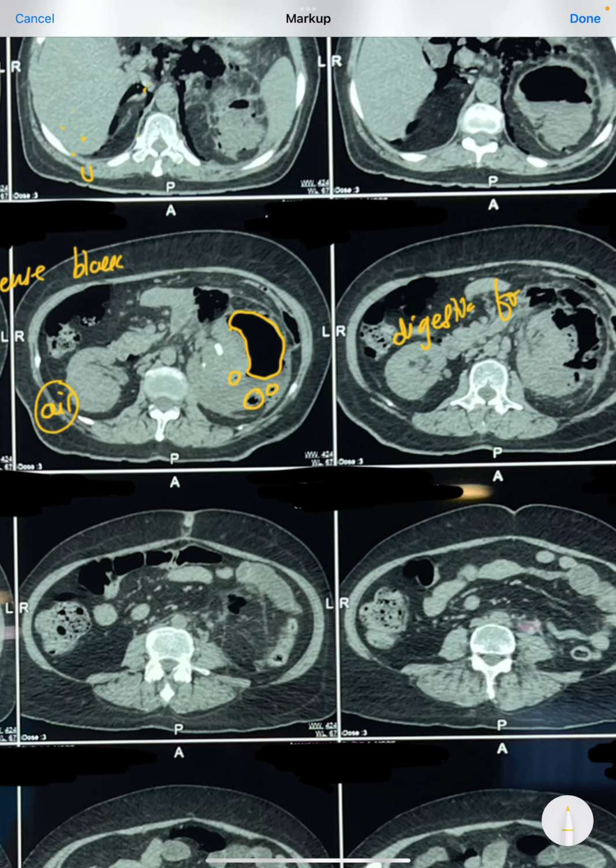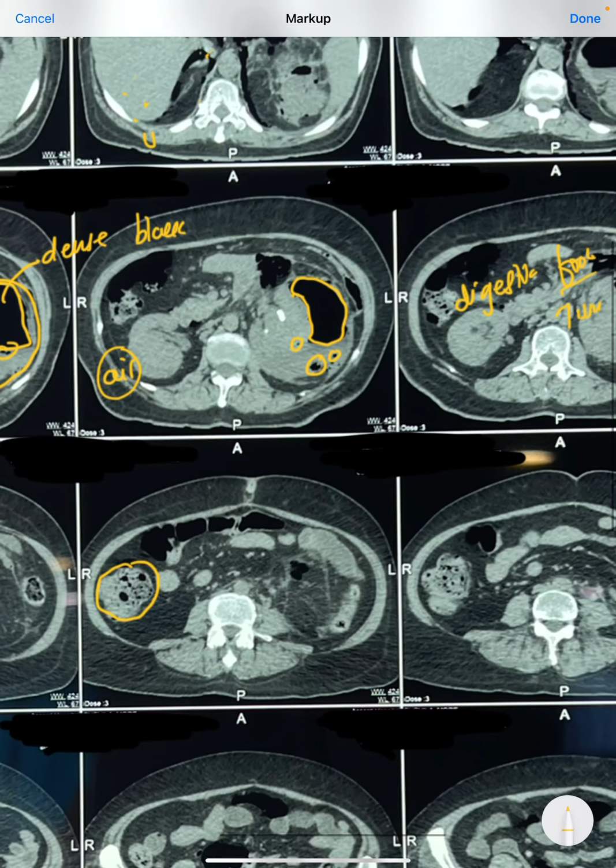Either it is food or a tissue which gets damaged, which gets necrosed, which actually creates or liberates air. So whenever there is air, either it has to be in the gut system like the small intestine or large intestine or stomach, which is very common like this. Now as this is the right side, we know that on the right side we have the ascending colon.